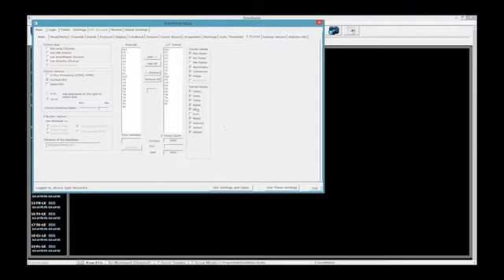But the alpha band is 7.7 to 12.2. So sometimes you're having extra Z-scores to train. Yes, the Z-scores are different there, but how effective it is, it might just be extra numbers. A lot of people that I know, and you're going to get some opinions, and it's best to ask on our listserv, will just check these off right off the bat.